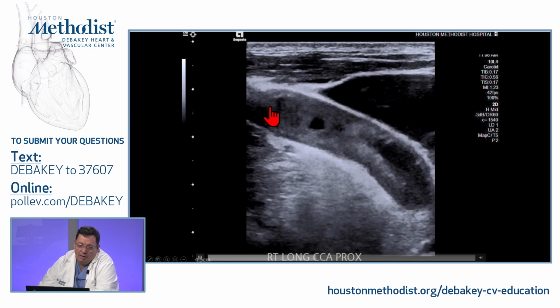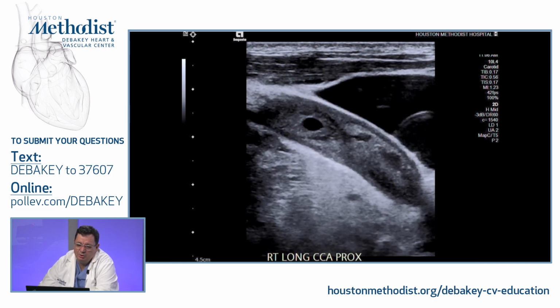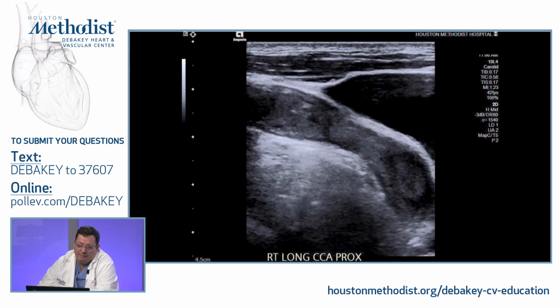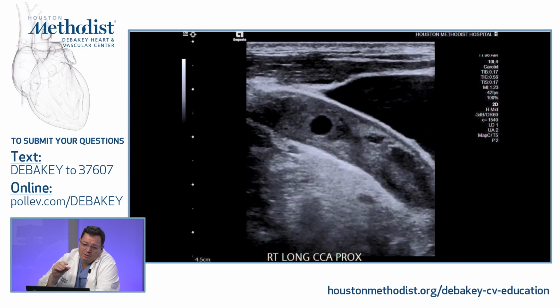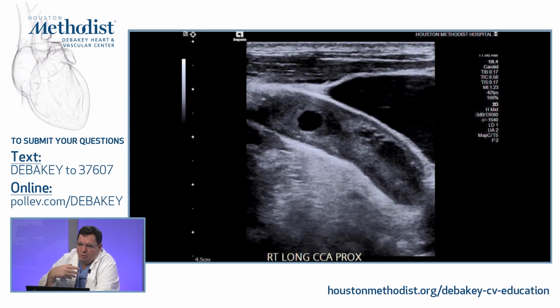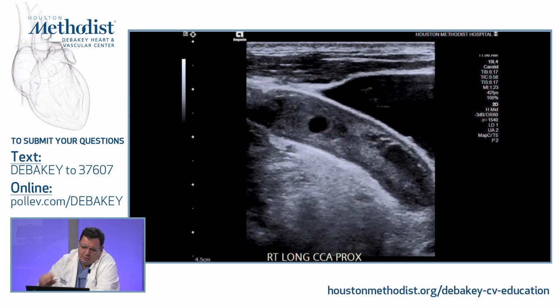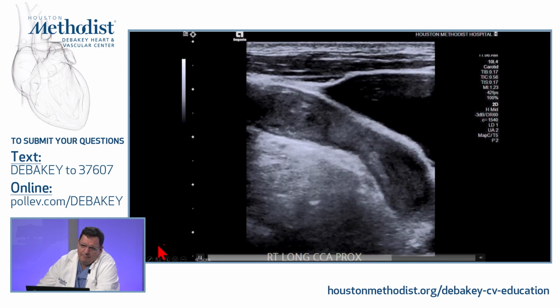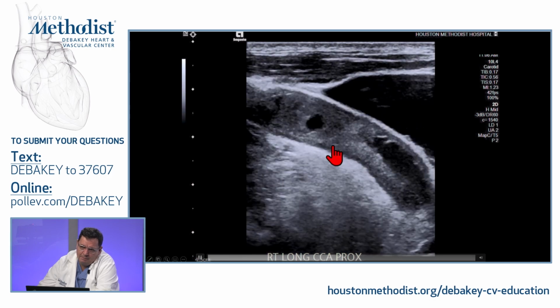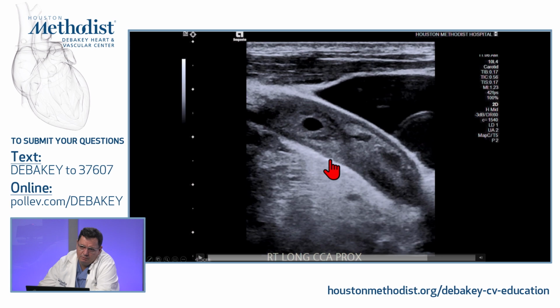And the second thing why I wanted to call it acute occlusion, and then I saw that we saw it in the previous few years, that's because the wall did not collapse. So when you look at the size of this vessel in a chronic obstruction, I expected a little bit less diameter for this vessel.